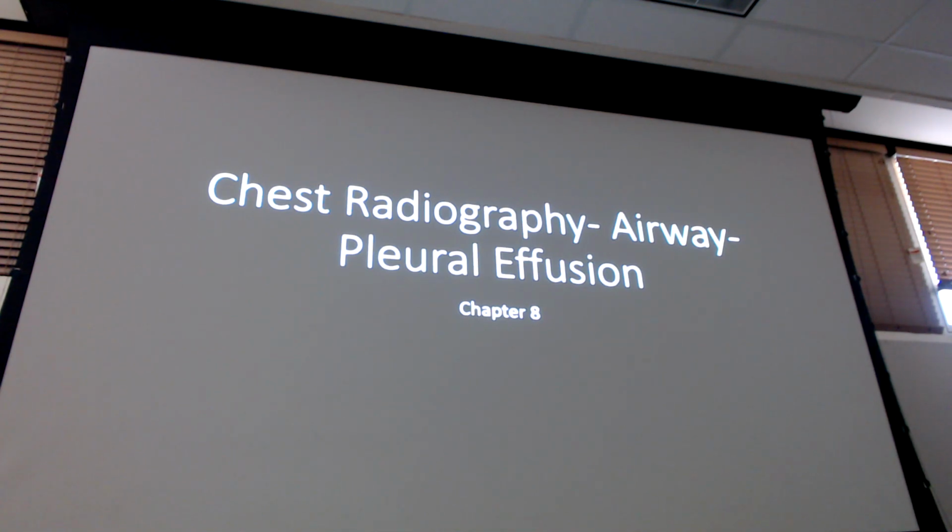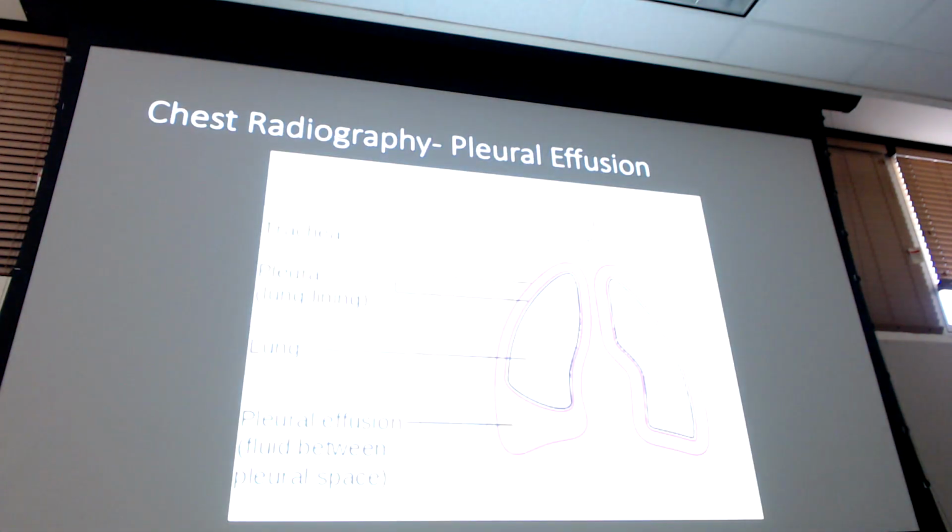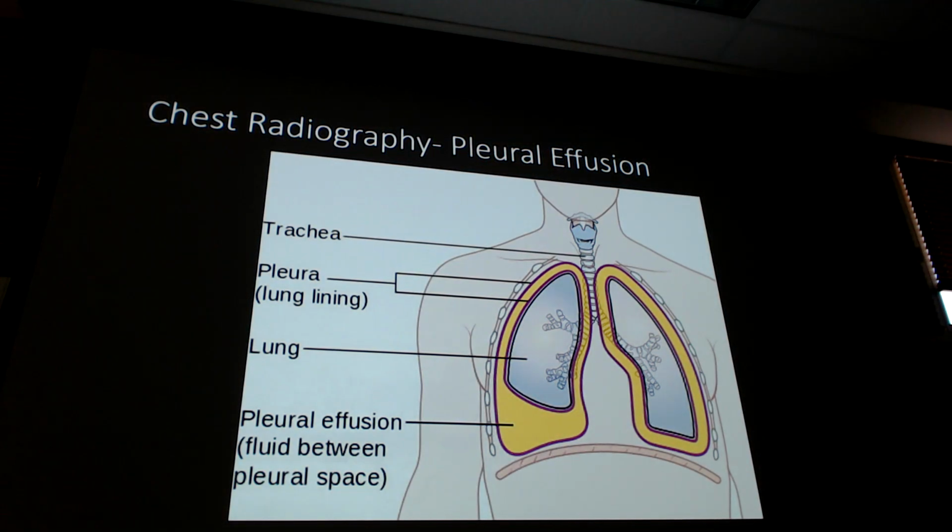So we talked about atelectasis. Now we're going to talk about pleural effusions. This goes back to that silhouette sign a little bit. I had a couple of good questions again on the break, as always. When they look at that silhouette sign sitting in that hemidiaphragm, it had that nice sharp costophrenic angle, and they asked, why is it just there and not over the whole hemidiaphragm?